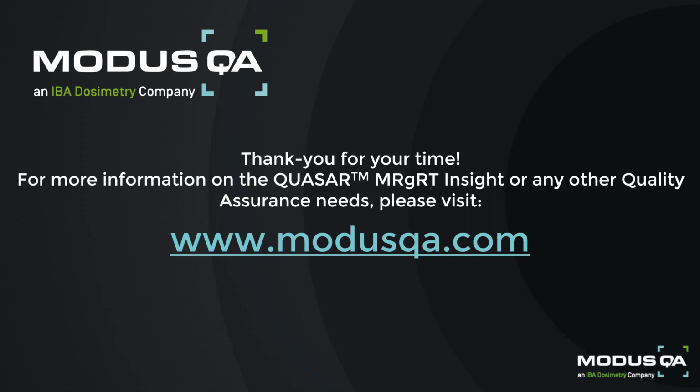Off the top of my head, it should measure 70 millimeters by 175 millimeters. And there is also a solid spherical target located at the center of it. So you can potentially fire your beam at it and then check if your treatment plan is being delivered as you wanted it to be.